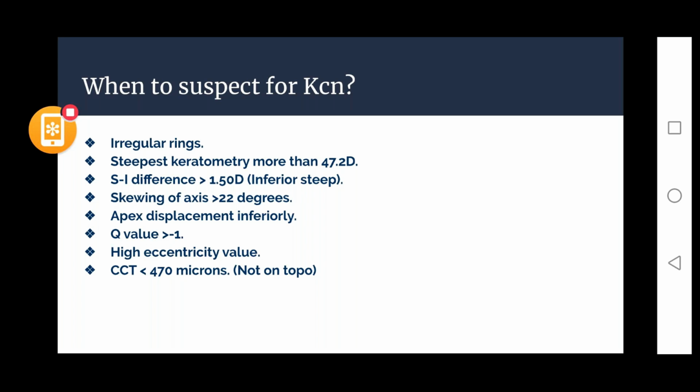One more thing. Prominent corneal nerves? No, not really. The patient's vision will not improve to 6/6. And one more thing, sir.